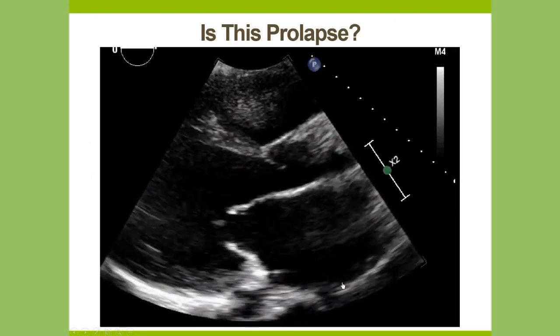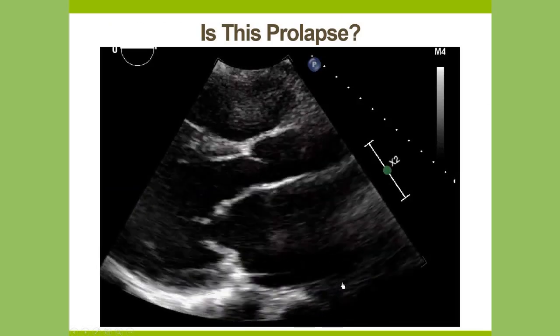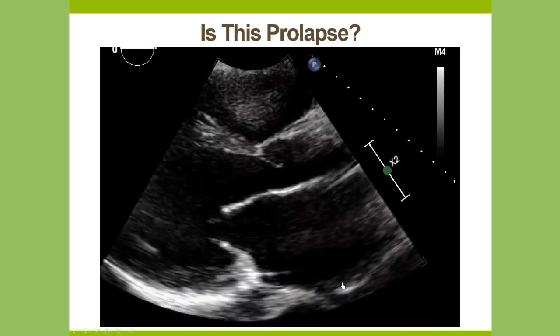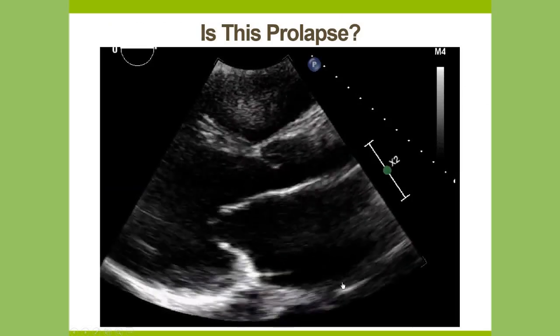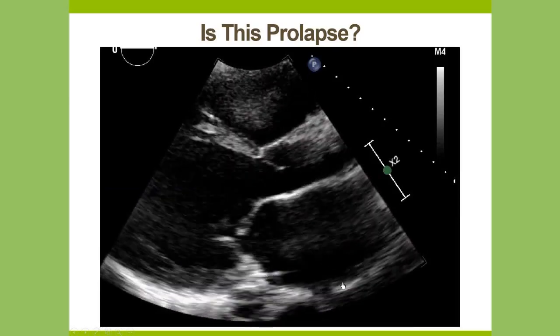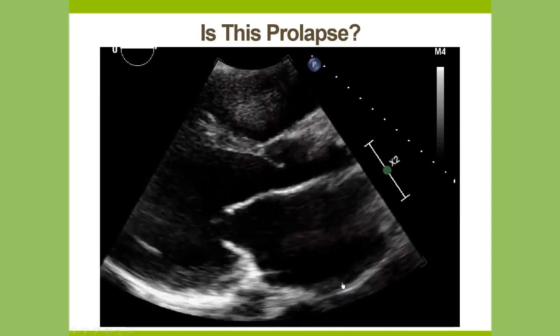So I have a question for you, and if we had one of these audience response systems, I would love to see the answer. We don't have that available, but I want you to think in your own mind. This is a parasternal long axis view. Is this mitral valve prolapse? Think in your own mind, yes or no, and we'll get to it.